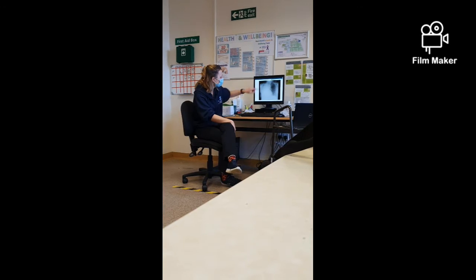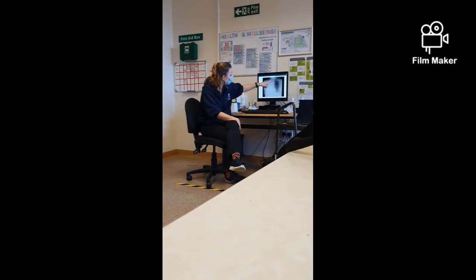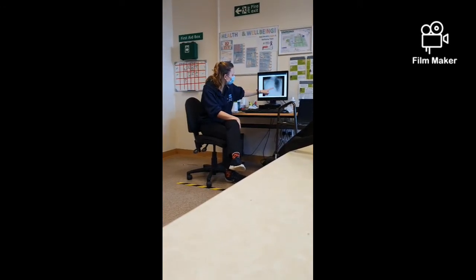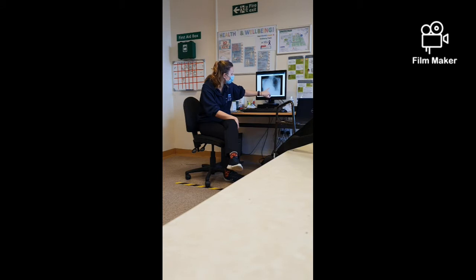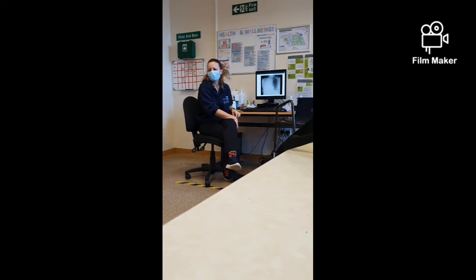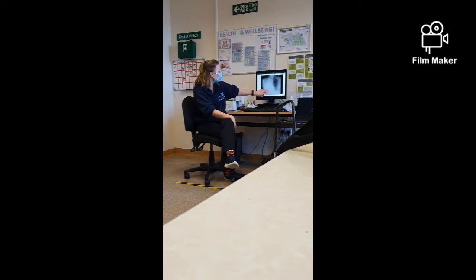You've not got clear borders. If we're thinking this is the centre, see how much on the left, you can't see it at all, can you? Well, you can't see it on the right, and then it's less on the left. Does anyone think it might have shifted at all? What do you think? There could be a little bit of shift that way, couldn't there?